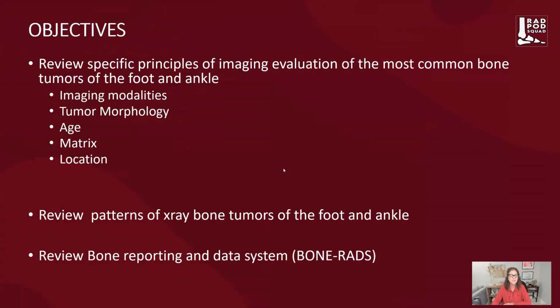Our objectives will be to review specific principles of imaging evaluation of the most common bone tumors of the foot and ankle. I'll take you through imaging modalities, tumor morphology, age, matrix, and location. We'll review patterns of X-ray bone tumors of the foot and ankle, and also review bone reporting algorithms to help identify who needs follow-up using bone RADs.